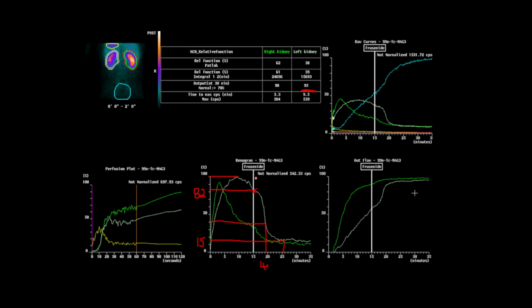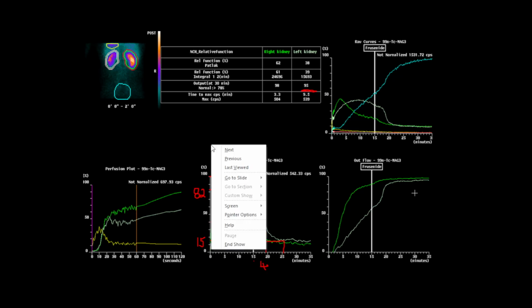So this is a patient who's had a PUJ obstruction and has had it treated with pyeloplasty, and I've seen the dynamic phase and the time activity curves before and after the treatment. So I think we're going to leave it at that at this point, and we'll look at some other of the slightly more quirky renogram curves in the next episode.